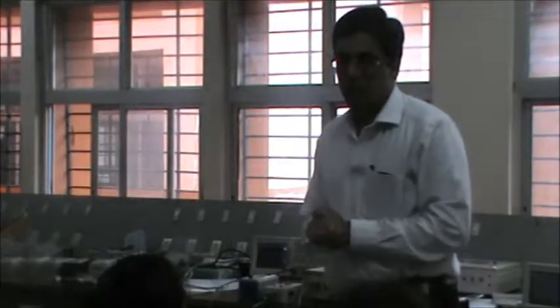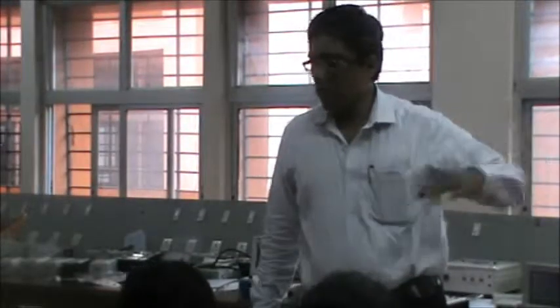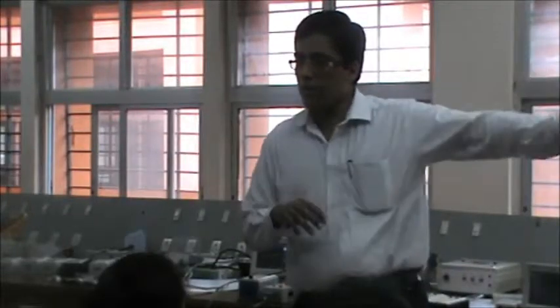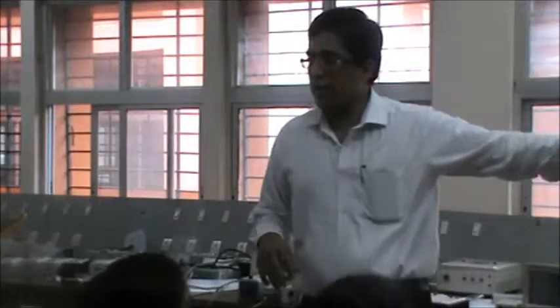So like this, if anybody is interested in studying particular leads and doing some kind of research, this kind of system becomes very useful. Whereas the hospital machine gives out the complete information, but you will not be able to record it. This kind of machine you can directly connect to a data acquisition system. So far we have been seeing only the analog world. Now we are going to go into the digital side and see what we can do.